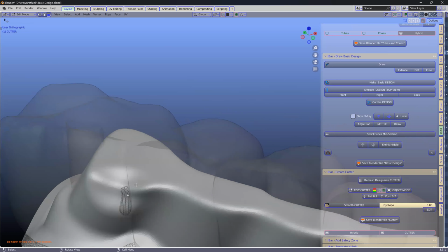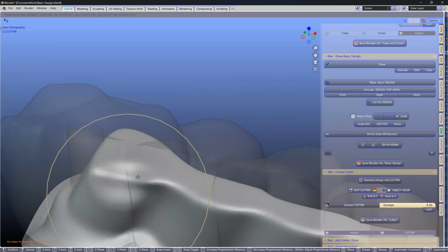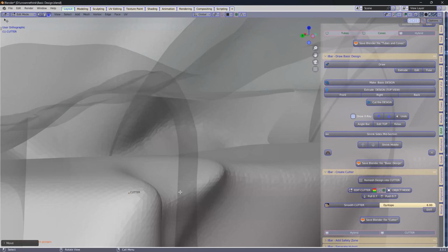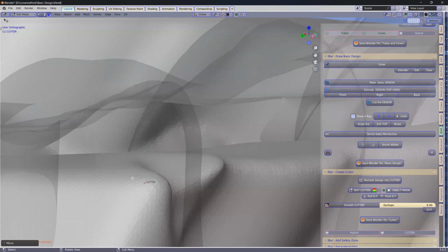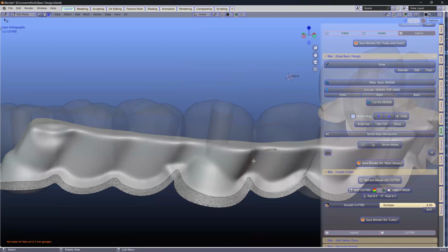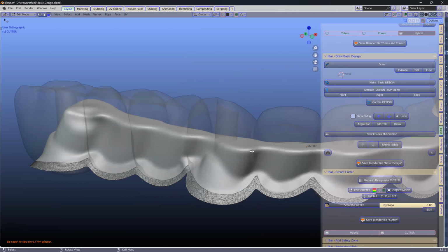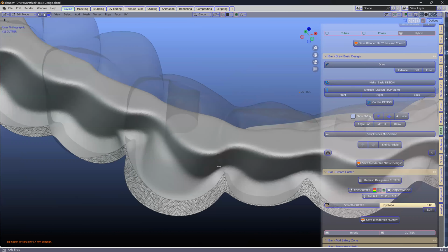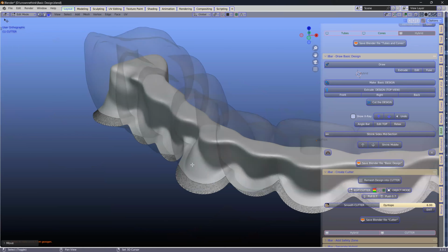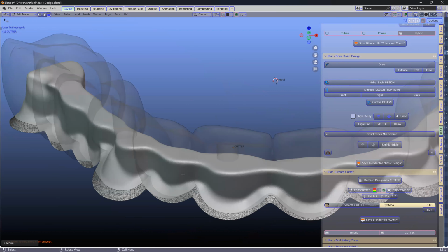Okay. So I'll just do this. So if you look at it carefully, your silhouette comes here and your bar now is being pushed inwards. Okay. So we're going to look for another spot coming up here. Okay. We're going to just pull that. Not yet. No, what it does, it's got a bar now and it's a minimum thickness.